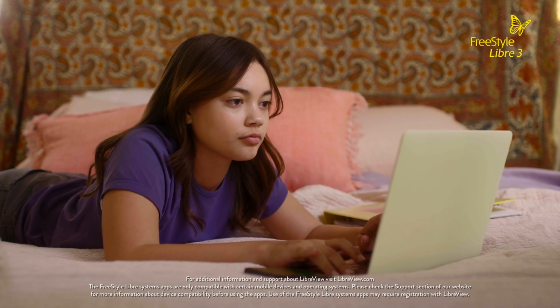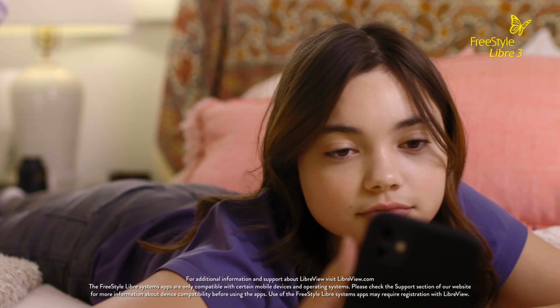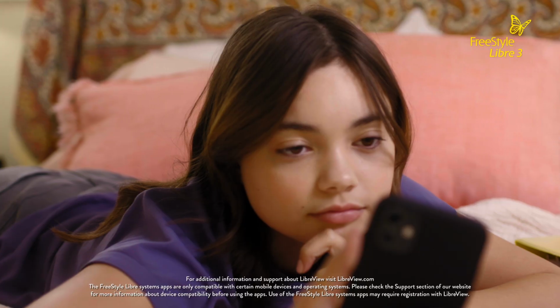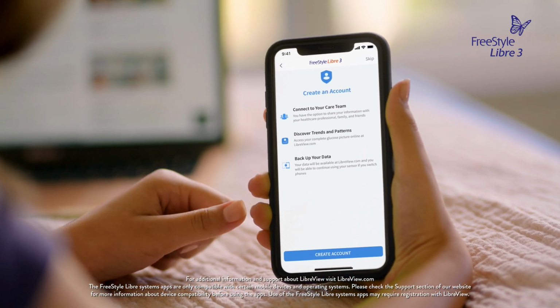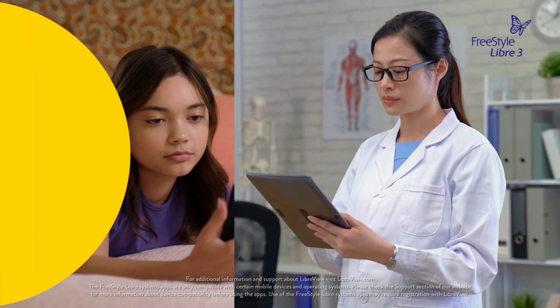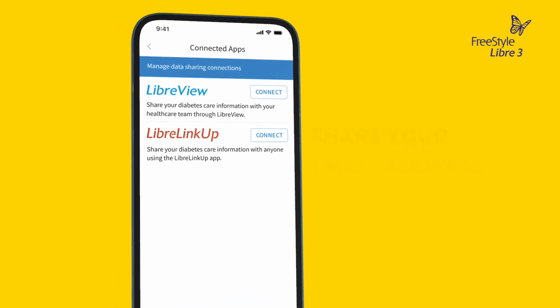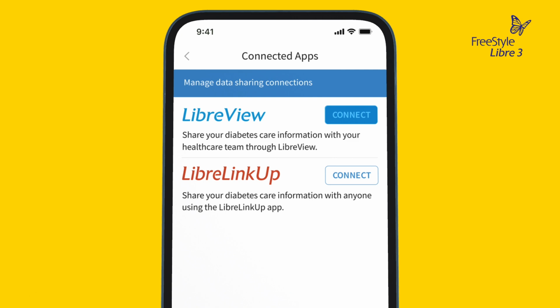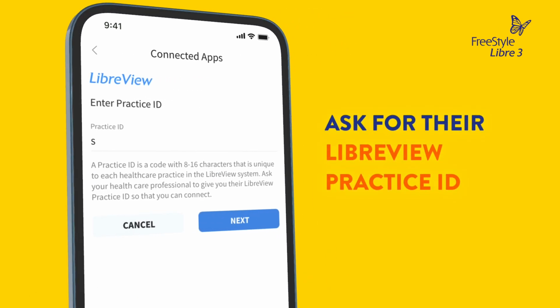The first step is to set up a LibreView account if you don't already have one. You can create an account right from the FreeStyle Libre 3 app. First, you'll need to establish a connection between your LibreView account and your doctor's LibreView account. There are two ways to do this. One is to share the email address you used to create your LibreView account with your doctor and ask them to invite you to connect. The other is to ask them for their LibreView Practice ID and enter it into the FreeStyle Libre 3 app.